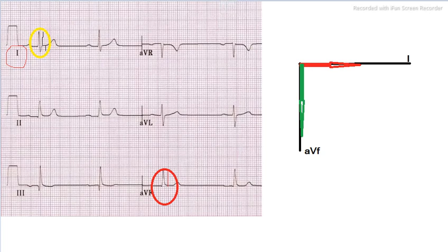Now what we do next is draw an imaginary perpendicular line in them. So I draw one imaginary perpendicular line from here. I may extend it to any length according to feasibility, and then I draw another perpendicular line from this vector and bring it here. So you see here the intersection point, isn't it? This is the intersection point here.